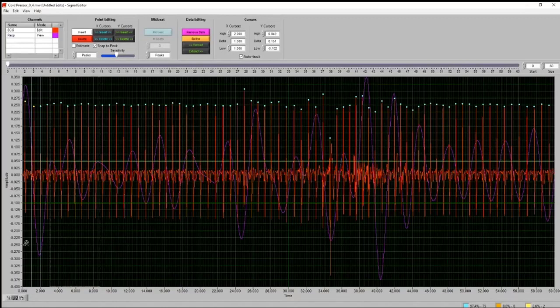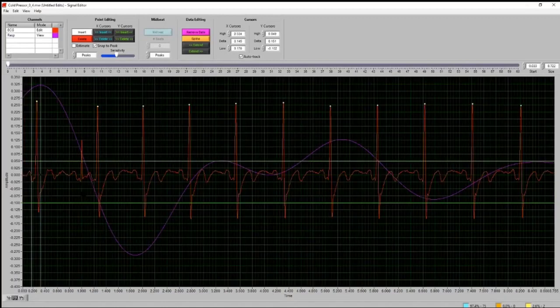data. Okay, so right off the bat, it's picking off this beat as being extremely long between these two. And if you look closely, we can actually see what appears to be another QRS complex, a little sort of mini one that occurs here. And so really what's probably happened is this, one of many different kinds of ectopic occurrences could occur. We really can't confirm them with the setup we have of a lead 2 configuration. You would need really that sort of clinical 10 lead or 12 lead configuration that you might have.